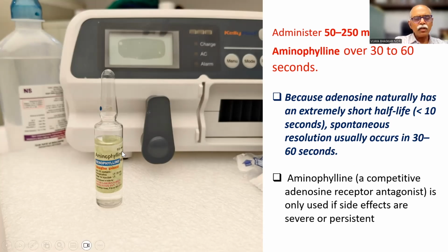That means dilute the aminophylline in 50 ml or 100 ml of saline and slowly infuse 50 to 250 milligrams over 30 to 60 seconds. Most of the time you don't need aminophylline. When you stop adenosine, all the complications will automatically get reversed.